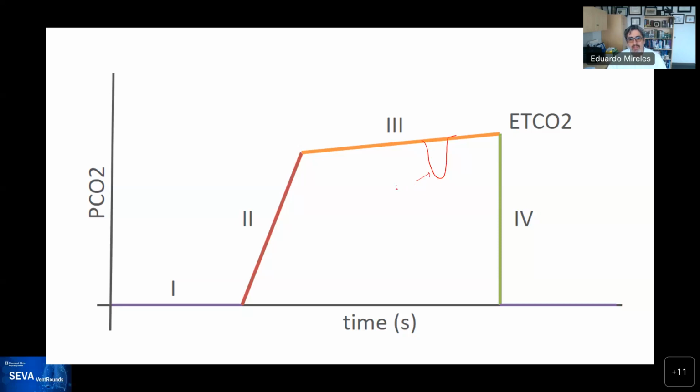Usually we think that is activation of the muscles, so there is inspiration. Or the patient may try to breathe out, and you may see it go up, which tells you there's expiration. Those are markers that may tell us something is happening.